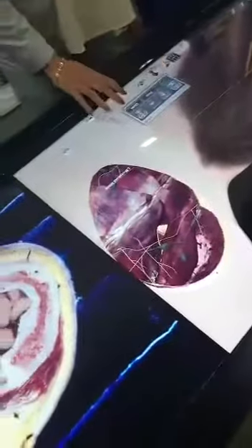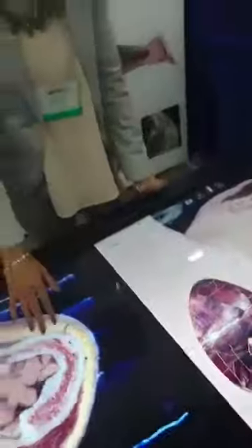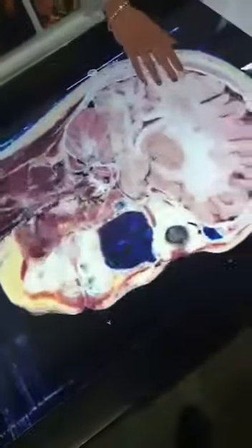And as I showed earlier, you can go ahead and also remove structures here and press this undo button. And what's interesting is these are actually the scans that were done from the cadaver. So everything you see here is what we saw at 0.6 to 0.8 millimeter thickness. And so each time I turn around, slide through these sections, I can see where the lines are.